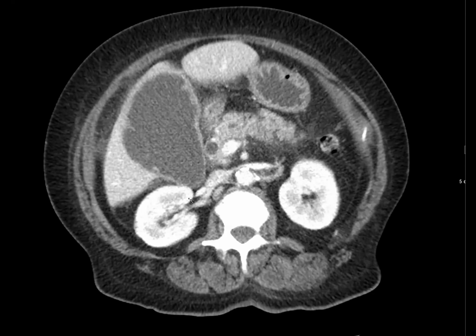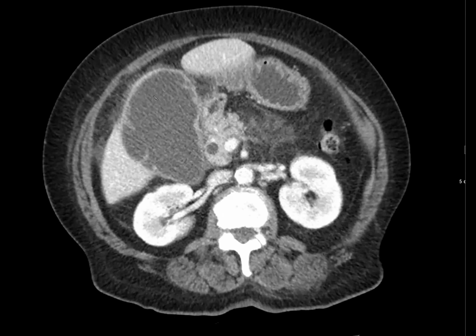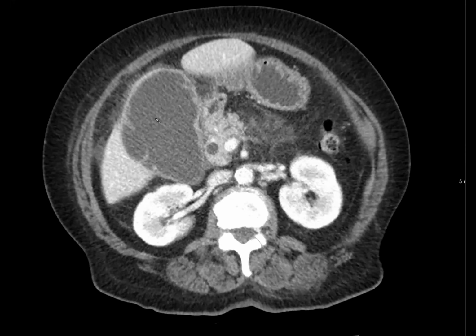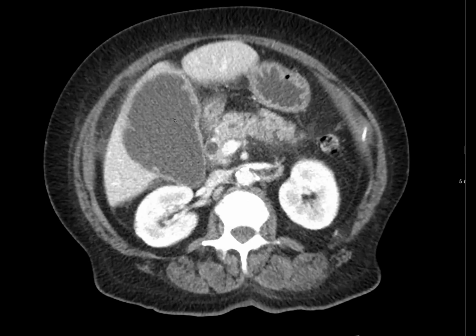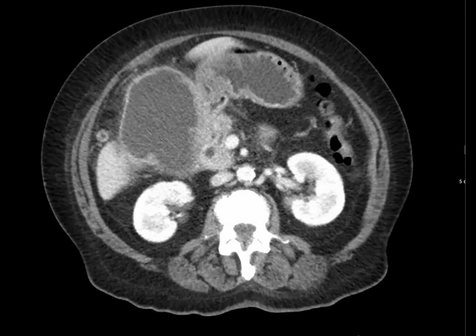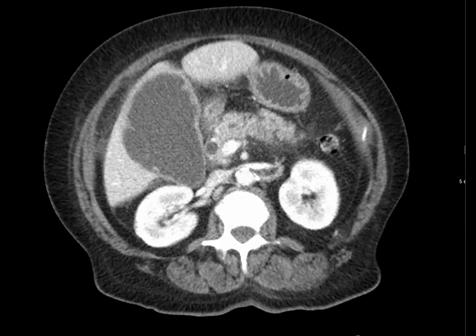They ended up doing a laparoscopic exploration, and there was pus coming out of the gallbladder. So this was, I didn't know this term actually, suppurative cholecystitis, which is when it's filled with pus or purulent material. I don't think we could tell that here. We can't tell the difference between gangrenous, perforated, and actually filled with pus. But they ended up putting in a percutaneous cholecystostomy tube, and the patient's doing better. So good, that's the end of mine.